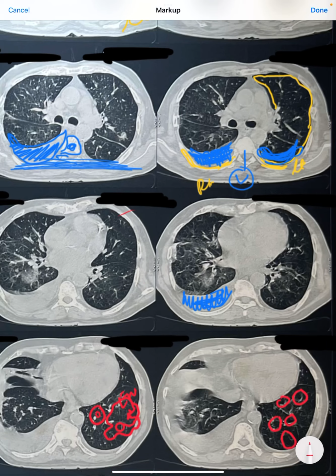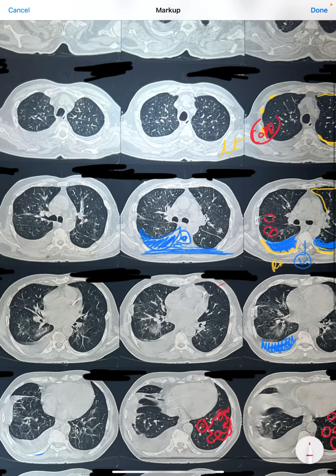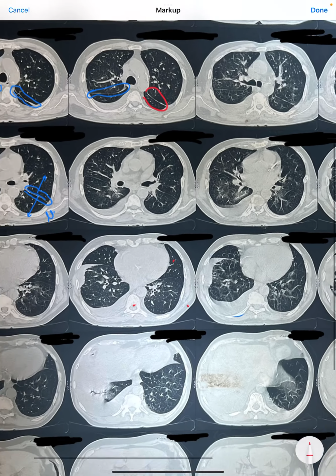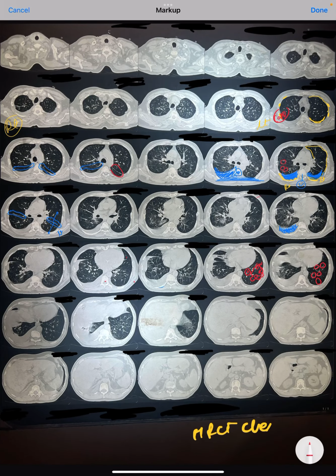We can very nicely make out here that there are so many small dilatations of this airway unit, which are diffusely present in bilateral lung fields, suggesting that this is a patient of COPD. So this patient has COPD, pleural effusion, active lower respiratory tract infection, as well as loculated effusion. That's all for today. Thank you.